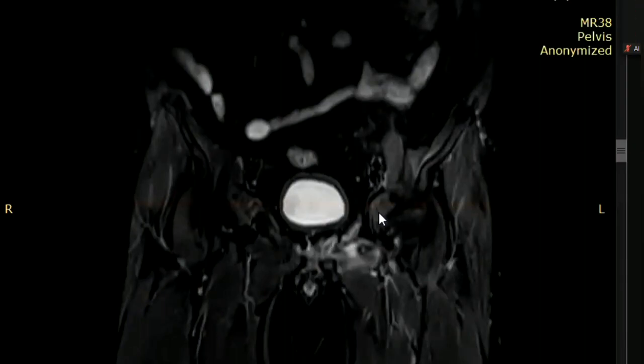After the CT, because the orthopedicians already did MRI, unfortunately I don't have the CT. But then you can always say that I see two areas of abnormality, so this can be metastasis. And the approach is that we should do a CT scan to look for the primary pathology, and also a bone scan to look for the multiplicity and the rest of the osseous skeleton.